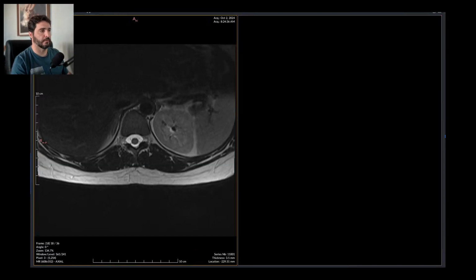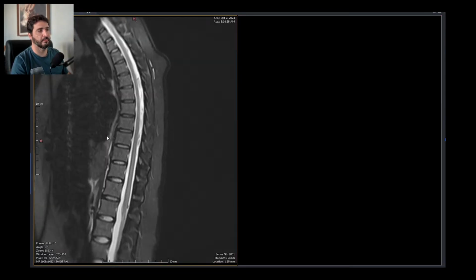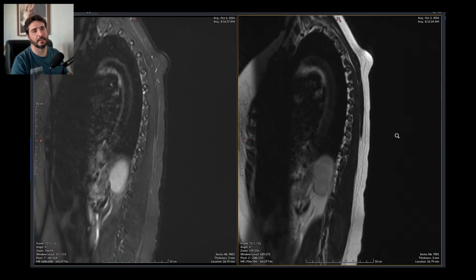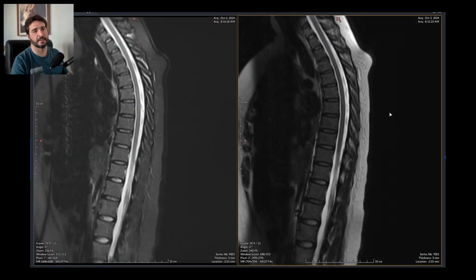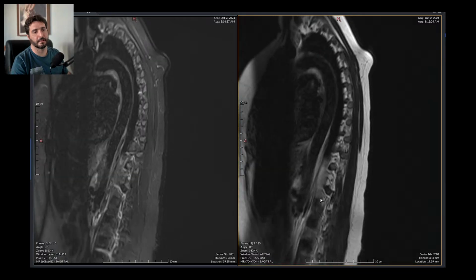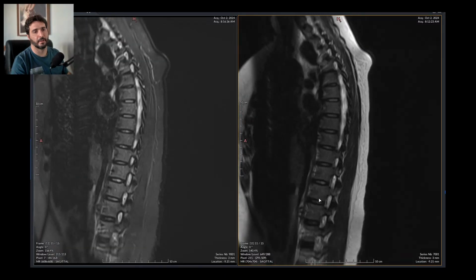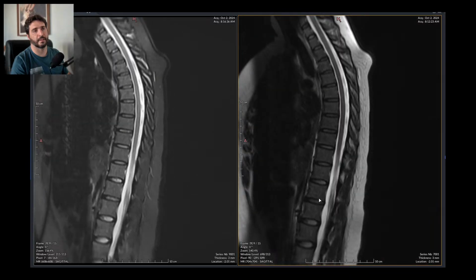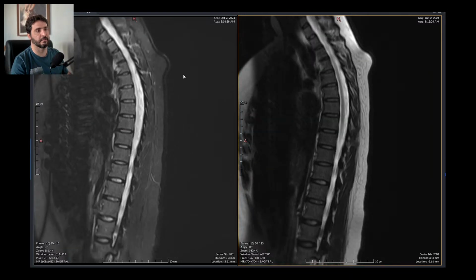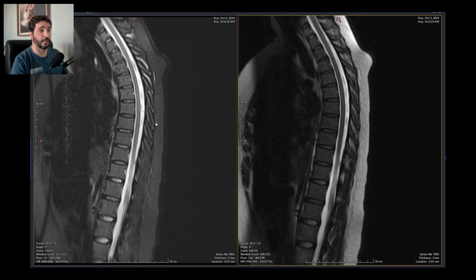Usually dorsal MRI scans are normal, especially on such a young patient, and I'm expecting nothing major of this exam. Morphology of the bodies and the posterior elements of the dorsal spine are fine. This is clearly a Dixon sequence, because the extremities of the sequence are awful.